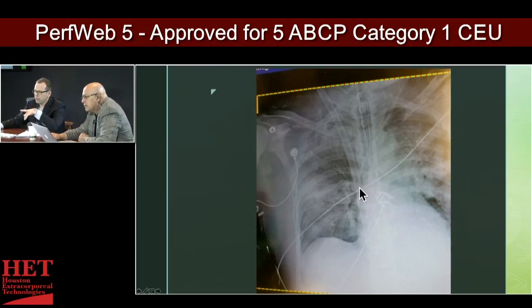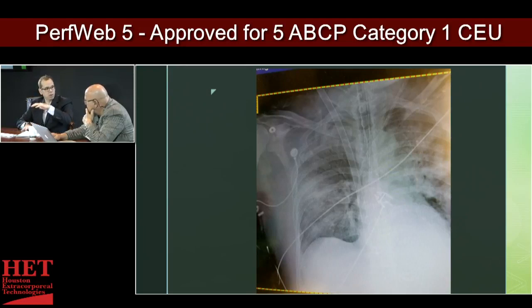The other thing about the Avalon cannula is they also have the side port with the marker that you can see as well. So that should be roughly at the right atrium SVC junction, and then the distal tip should be further below, well below. Now, whether the tip of the cannula should be below the diaphragm or above the diaphragm depends on the technique of the film, also the habitus of the patient. If they have flattened diaphragms, it may be pushed way down, the mediastinum may be elongated, and so that IVC is in fact above the diaphragm on that x-ray.